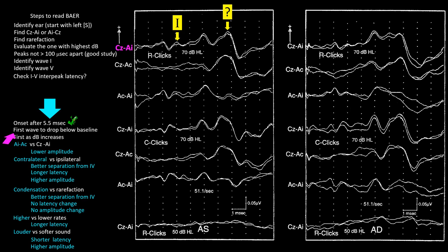Next item is the one we use to choose the putative wave 5. So it is certainly met. The wave thus crosses the midline. Therefore, this item is met.